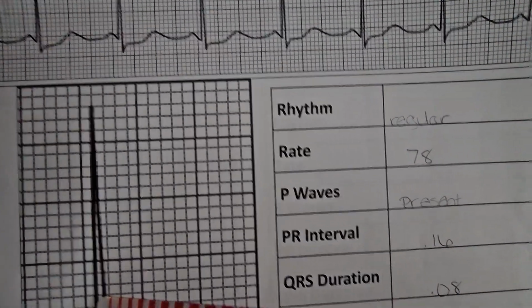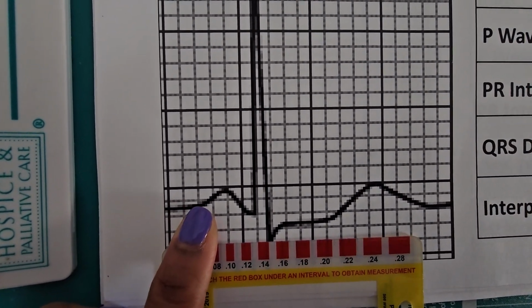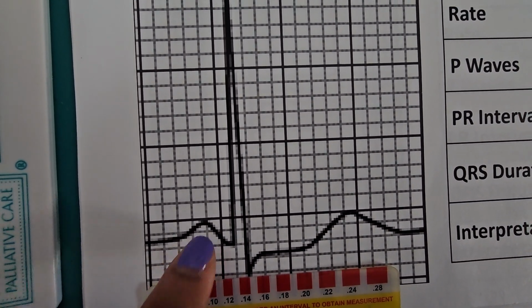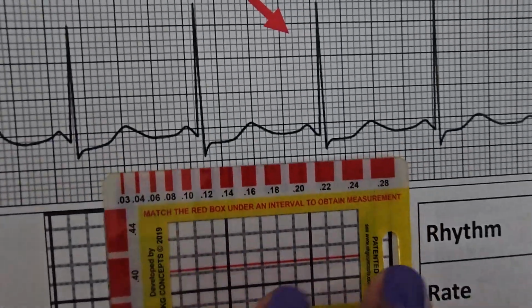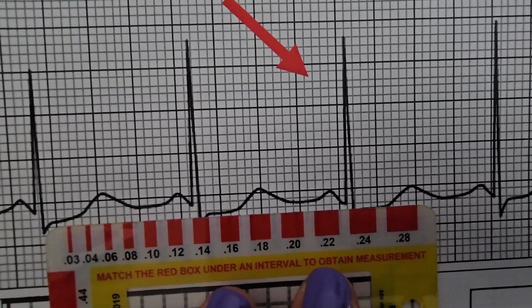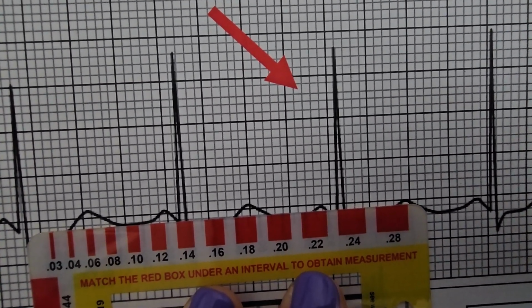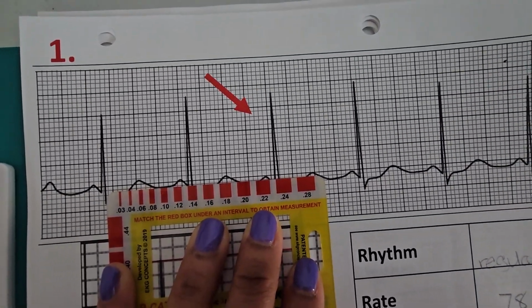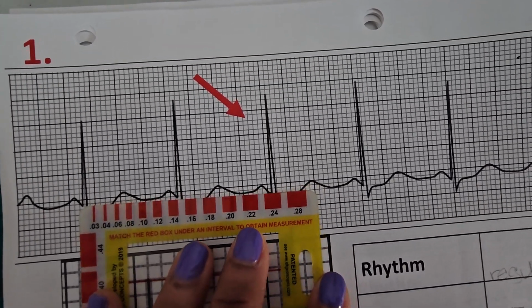So let's see if I can do that. Okay, so I have my PR interval, which is measured from here to this Q wave here. But if I measure the bigger one, it won't come out right. So I do have to go up here to measure that. And I'm actually going to start here, right where that P wave starts. And as you can see, my PR interval is longer than 0.12. So I immediately go over to 0.16 instead of the 0.14 because I don't see any half boxes.